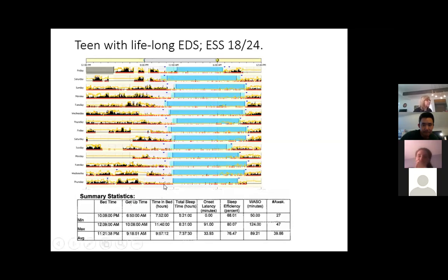It's kind of interesting because he says he got into bed, but the device says there's too much movement to be asleep here. I don't know if that's an algorithm problem or what it is, but the algorithm said this is wake and this is where I put sleep. So this wasn't easy to score because I'm the one that ends up assigning these things. I guess I could have put it here, but then the sleep efficiency would have been much lower because it scored all this as potentially not sleep, as looking like waking.